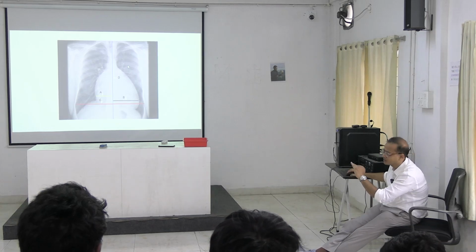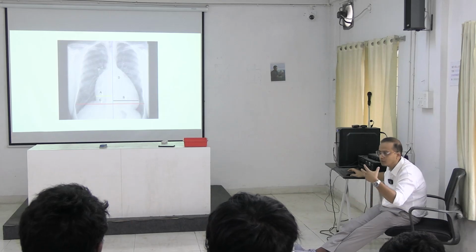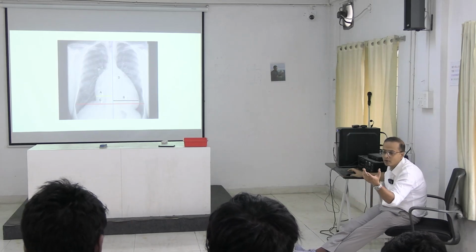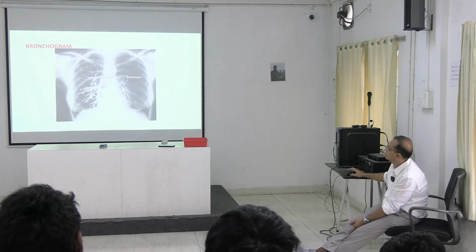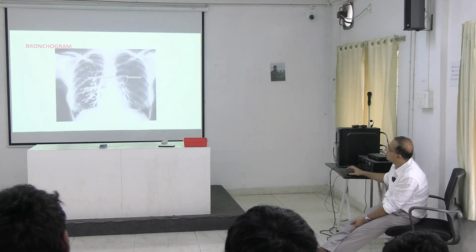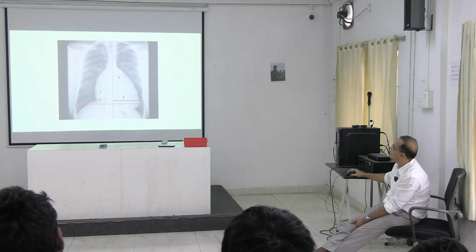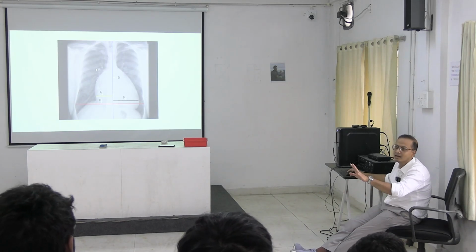So this is how we are seeing the abnormal things. But the abnormal thing is not for us. Unless you know that these things are abnormal, how can we tell? We compare it with the normal things. Alright. Now you are seeing something special out here. Before that, you are seeing some markings out here. See that? These markings you are seeing here are just like thin lines.